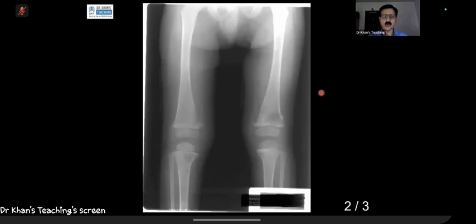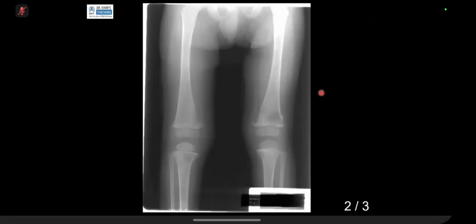Okay, what is it now? What is your differential for all of this? Yeah, I will look for the differential diagnosis for sclerotic bands in the metaphysis. First, I will think about poisoning, such as lead poisoning. In some cases, it could be normal. Another differential diagnosis could be hypervitaminosis.